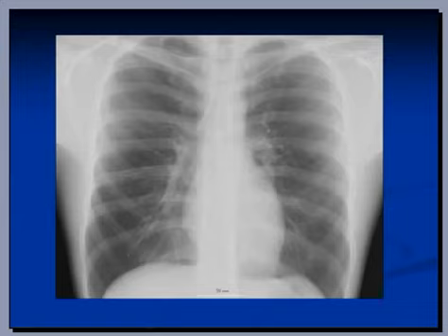So how is it diagnosed on a chest X-ray? Remember, in one of the previous videos we discussed that vascular markings should be visible on a normal chest X-ray. So we're talking about these blood vessels, these white ones, or opaque lines as we call them. They're tapering off and then branching off, and they're going through the lung parenchyma on both sides. So that's how a normal chest X-ray should look.